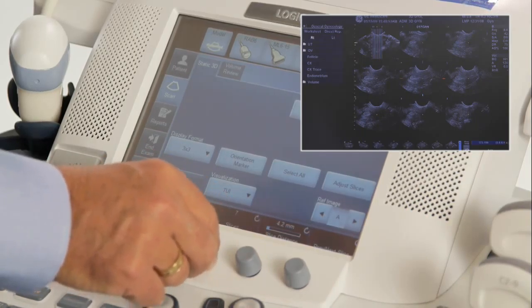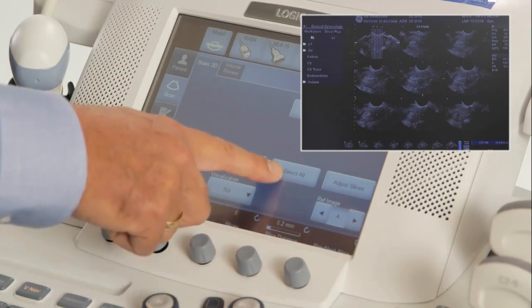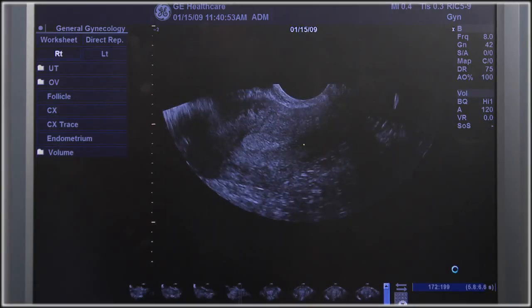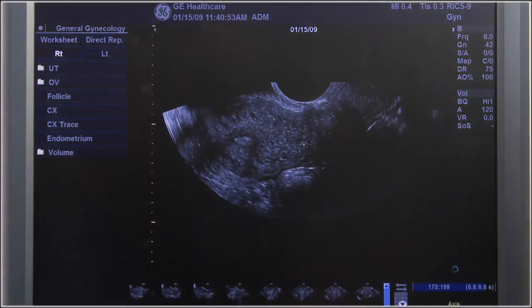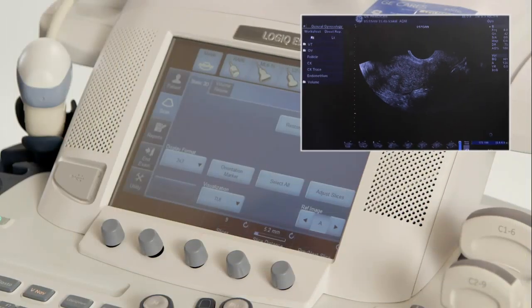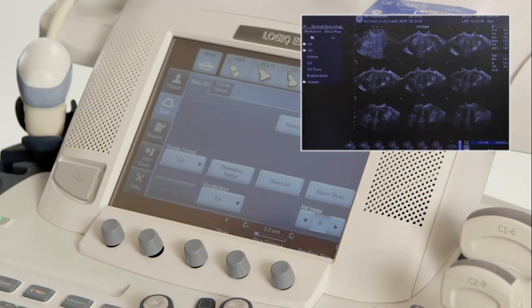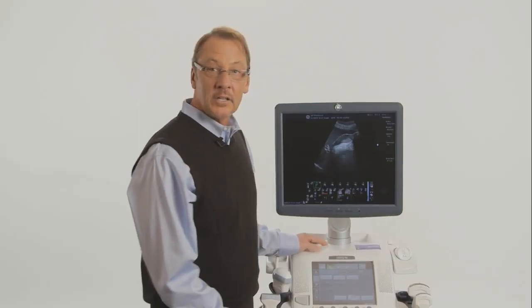Once you have the data displayed in the manner you wish to capture and send, you can press the Select All button on the touchscreen and then print. You can also simply print this page for a single image capture of this data. Select additional image planes by changing your reference image selection on the lower right hand of the touchscreen. Select all and print. Consult your applications or sales specialist for any additional information regarding volume imaging protocols.